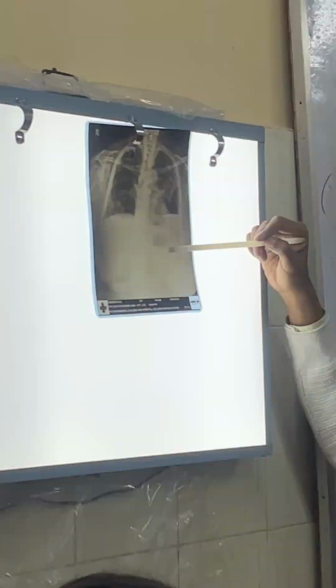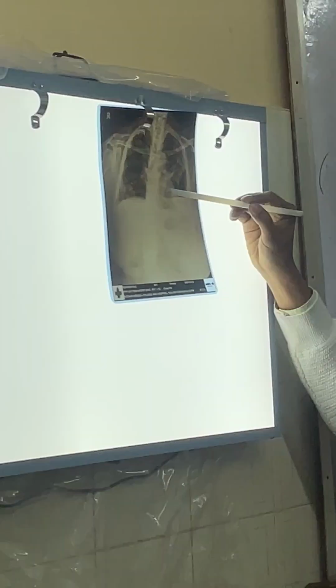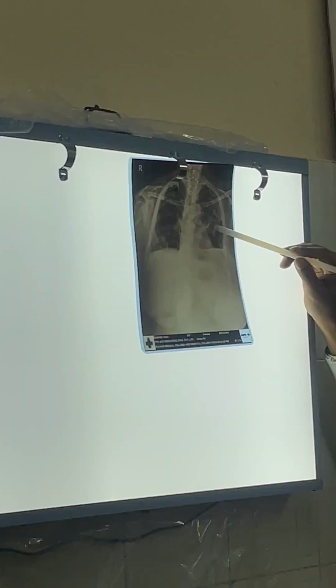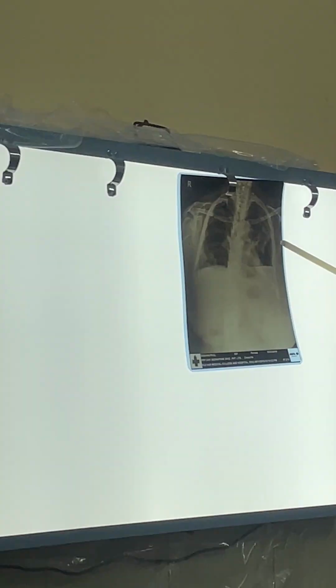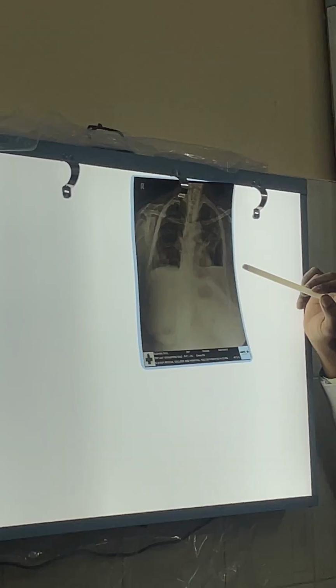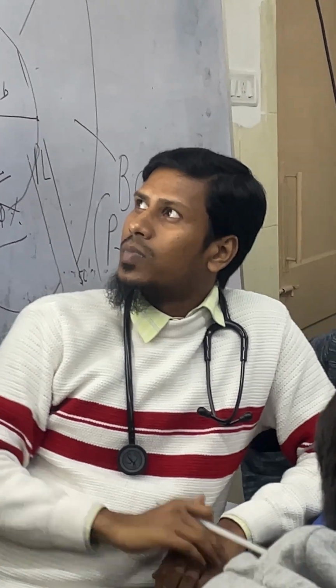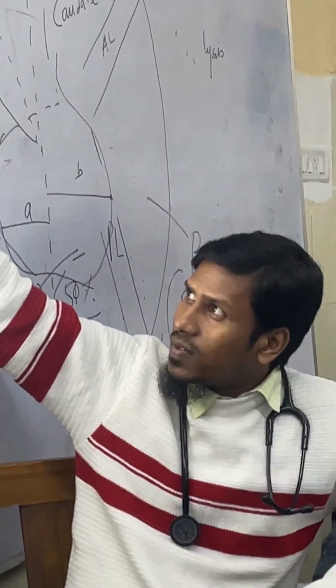In this area, there is the advanced picture. If you see this entire area, this is the air and below is the fluid. So this is known as air and fluid, pneumo and water, hydropneumothorax. You have to look from closer. There is a margin.